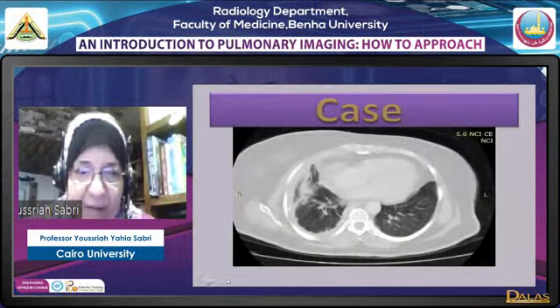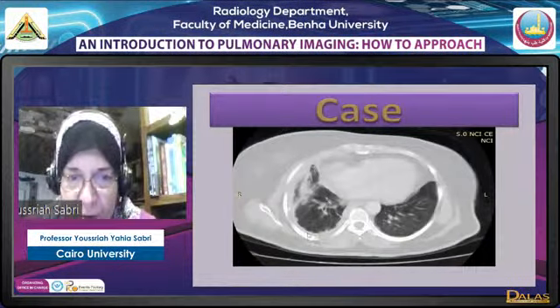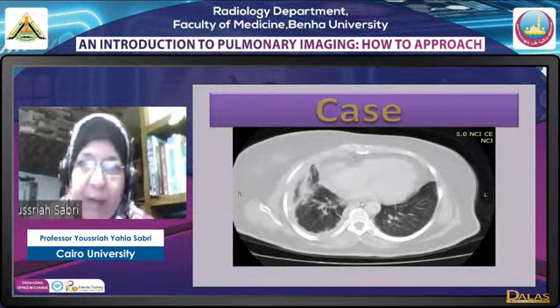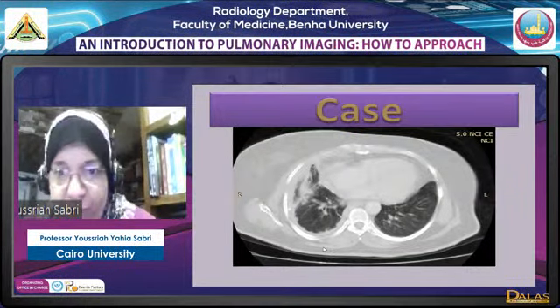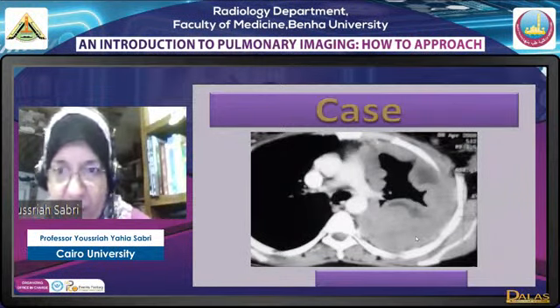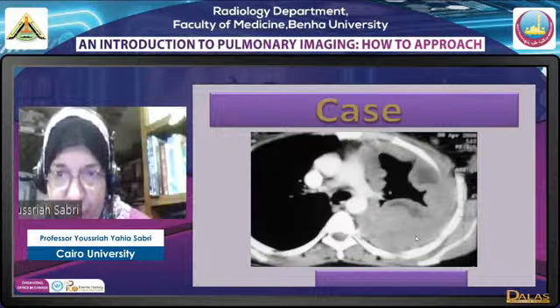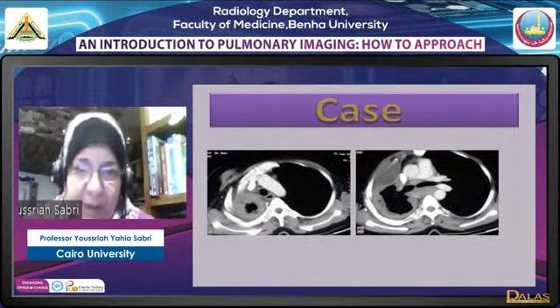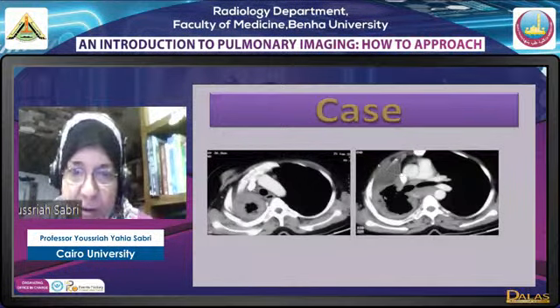Now here we have circumferential nodular thickening on top of an asbestos exposure. This will suggest that we may have a mesothelioma. Here, on the other hand, we have the typical appearance for radiologists of a mesothelioma, which is circumferential nodular thickening of the pleura. This is a mesothelioma. Another appearance, nodular appearance with decreased volume.